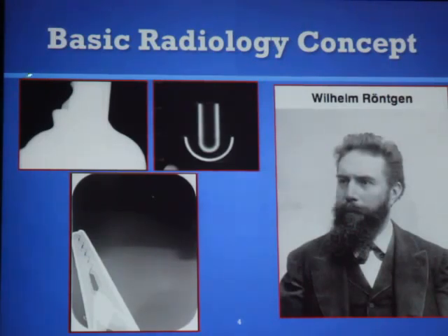So to come from that X-ray to that X-ray, why it makes sense? Because we can see the two different color and or more than two different densities of the object here. We can see it is much brighter here, then it is lighter in the middle, then again it's brighter. There is black color, and you can see the shape as well. What it creates is a contrast between two different objects, and that helps us to identify the object on the radiograph.